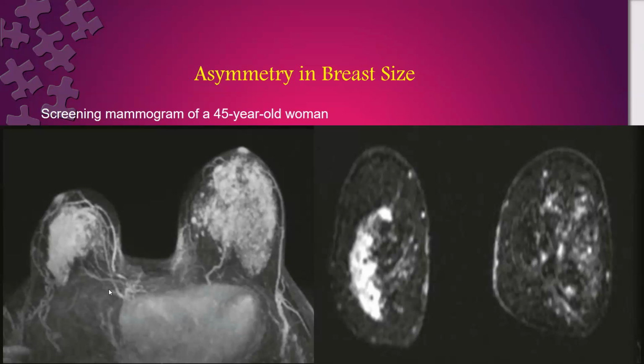Pathology, this is pathology. Cancer. What do you expect to be the malignancy in this? And what is this sign? You know it, Suhair. Lobular carcinoma. Lobular. Excellent. Why lobular? Non-mass like enhancement. Yes. Why? What is this sign?